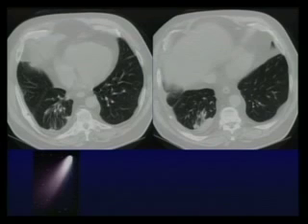Actually, if you are giving a contrast material, on the CT you will see enhancement because there is a collapse of all the vessels. If you are ordering a PET CT, it will be positive because there is inflammation over there. So the only way to differentiate a rounded atelectasis from a tumor is to see this type of sign. So for that reason, it's very important.